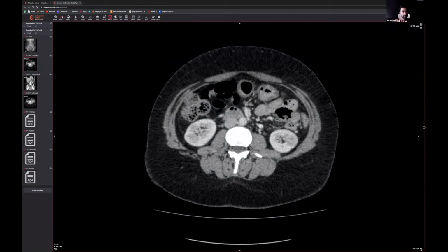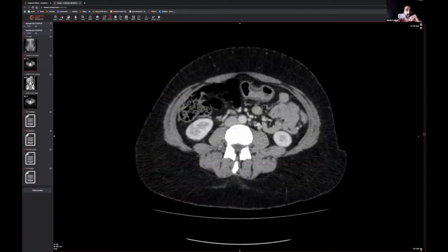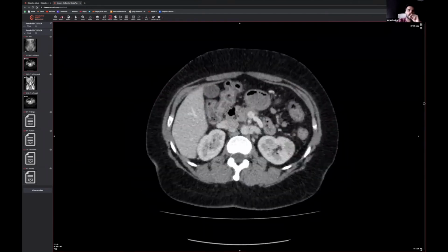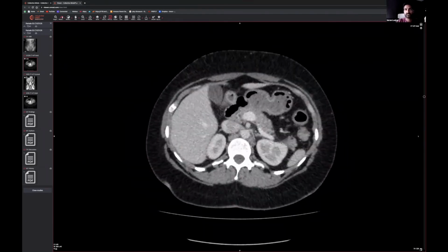But when you've got what looks like quite uniform inflammation, the sigmoid colon going up the descending colon and up to the transverse colon, you're looking at multiple vascular territories here. And when you've got multiple vascular territories, you're less likely to be looking at ischemia. So I wouldn't go with segmental inflammation. I'd just be going for a uniform inflammation involving, and just describe it, sigmoid colon, descending colon, transverse colon, with some loss of the normal features on CT as well.